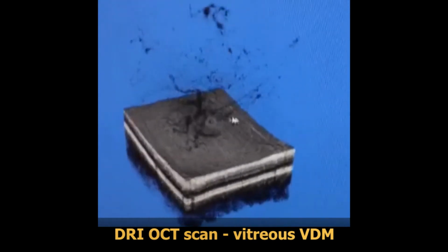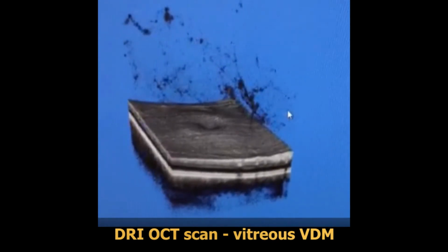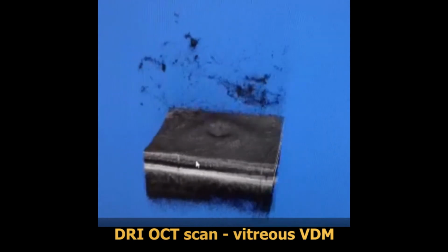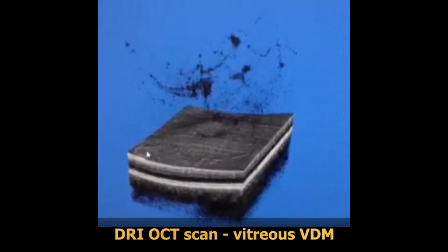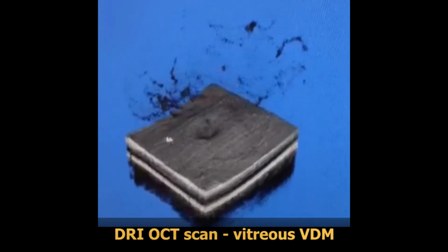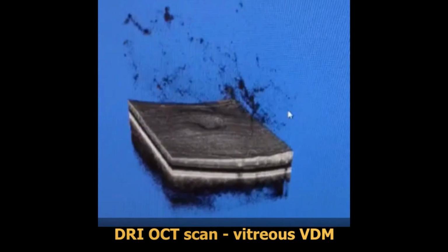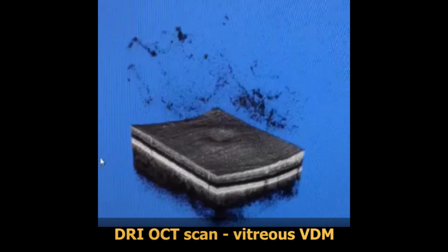the eye. At the very bottom is the sclera, above which is the choroid. The interface between the choroid and the retina is demonstrated by bright white lines, and the uppermost layer is the retina, which lines the inside of the back of the eye and acts like a film in a camera, receiving the light that was focused by the structures in the front of the eye and transforming those photons into electrical signals that are transmitted to the brain where vision is completed.